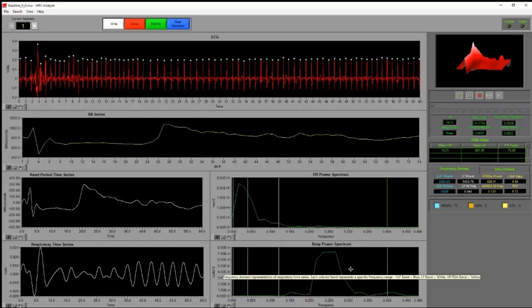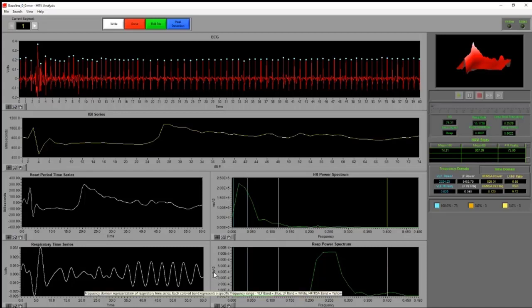And so one of the things to do is to ensure that what we're looking at is actual respiration data and not something else, not noise. And we want to make sure of that. So one of the things to do is we're going to look at the respiration rate and just very quickly visualize to see if that makes sense. And really we're talking about maybe plus or minus 5 respirations. And we're not going to go in and count. It's just a simple visualization to say, is this 60 or is this 6? How far off are we? And then 15 looks just fine.